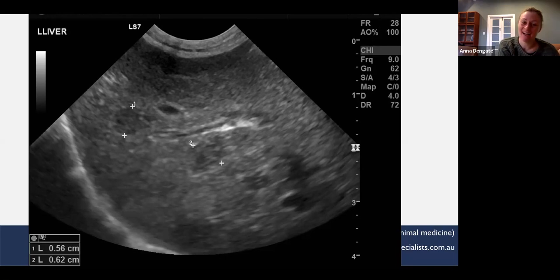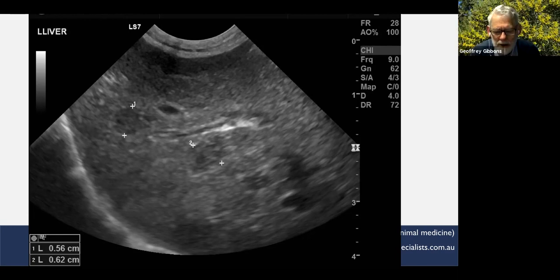You've done well. So I think the only other thing would be potentially neoplasia, which is causing extraluminal pressure on the caudal cava, or neoplasia of the caudal cava itself. So we've sort of talked about the heart, but not so much the actual cava, but it's so rare. But it's called Budd-Chiari syndrome when it's the cava or the right atrium. Yeah, like a precardiac mediastinal mass, cranial mediastinal mass.